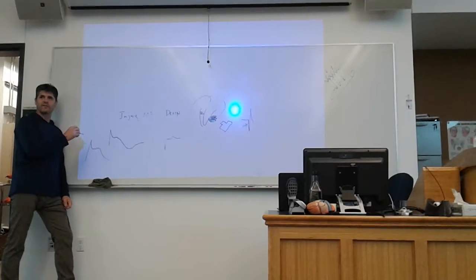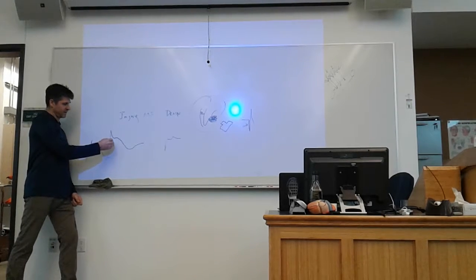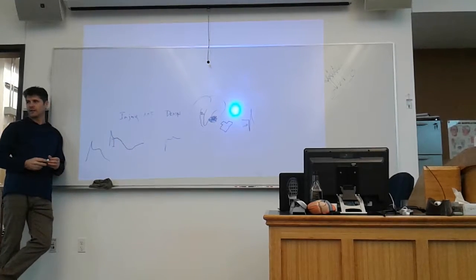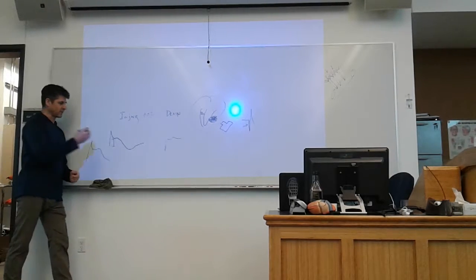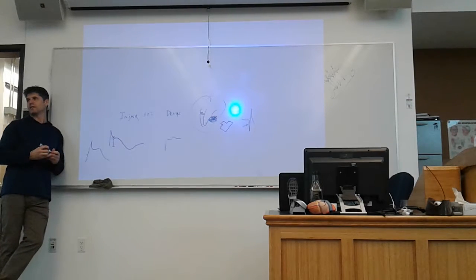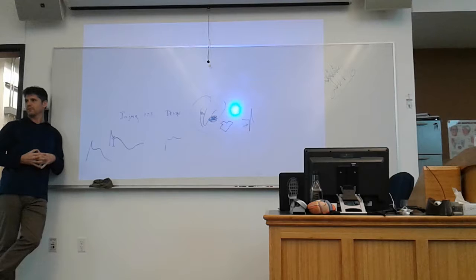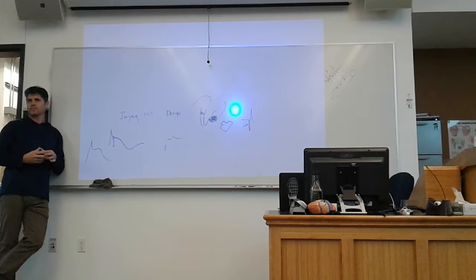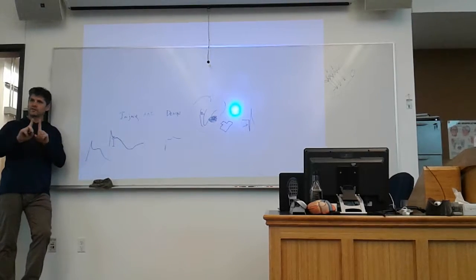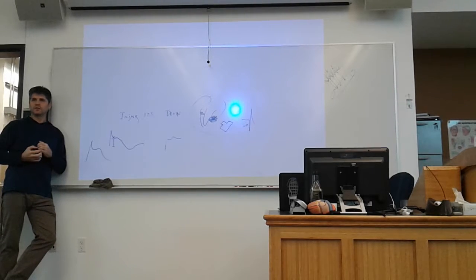What denotes the level of tissue injury in a given lead is the height of the ST segment, the height of the J point. The higher it is, the more tissue has been damaged and is unable to relax, unable to repolarize properly. And you could say more leads with ST elevation means more of the picture is being affected. Often, the higher the ST segment, the more it's usually translating to other concurrent leads. That's typically true.